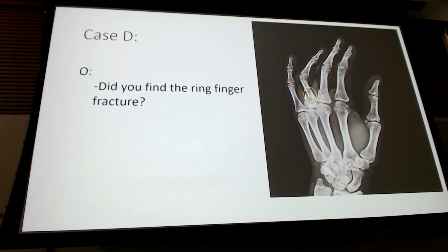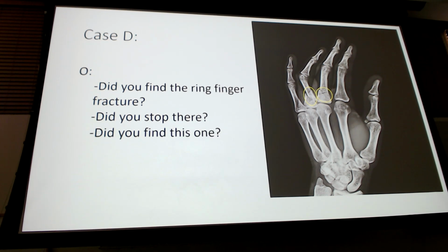Did you find the ring finger fracture? Good. I want you to look there because that's where the pain's at. That's where it first started. That's the concern. Did you stop looking at the X-ray after you saw the shiny toy? No. Why? I told you not to. So then did you find that fracture?